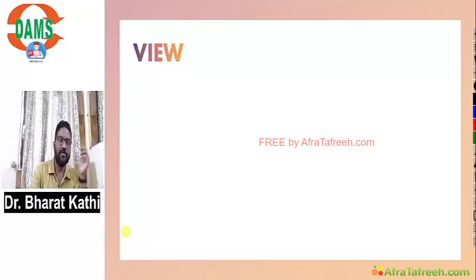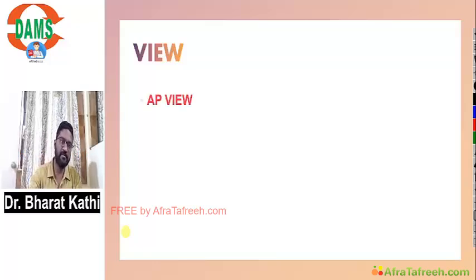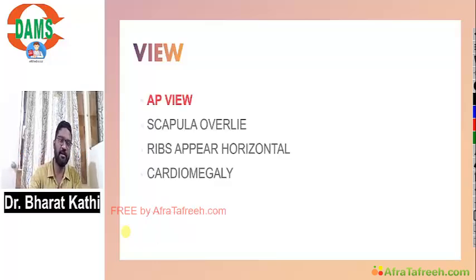Now I'll quickly tell you how to identify whether it is AP view or PA view, and those students in the chat box, you can answer. When do you call it a PA view? When do you call it an AP view? First question, when you say it is a PA view, the examiner will ask you, how do you say that this is a PA view? Let us understand the difference between AP and PA view.